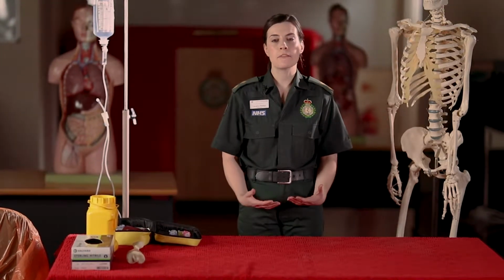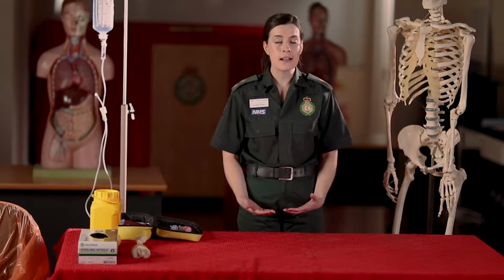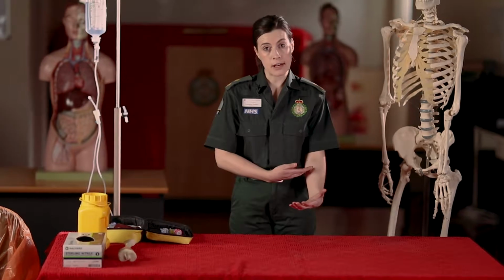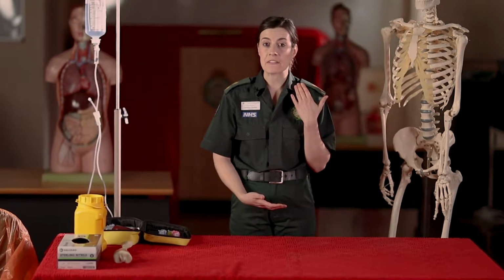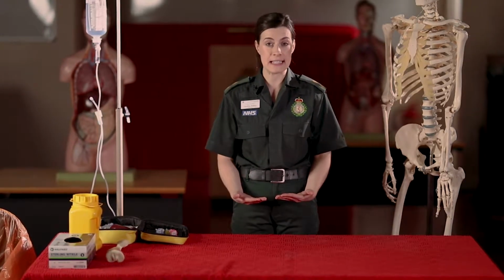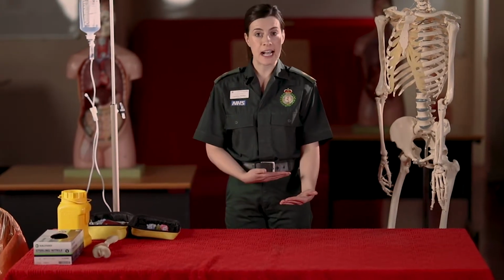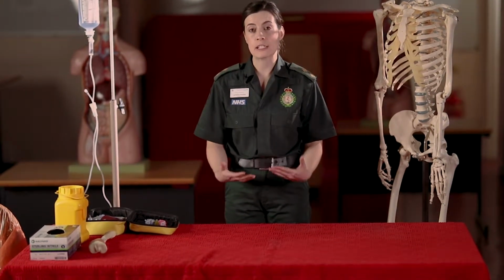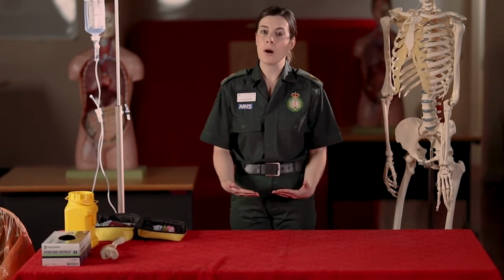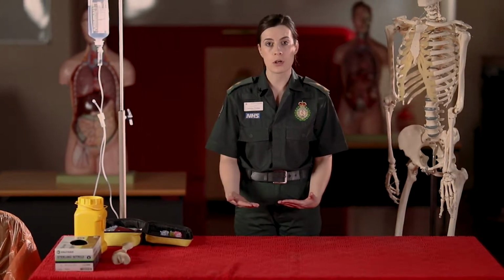The indications for performing an EZ-IO in an adult patient in cardiac arrest are that ideally we would like you to attempt a peripheral site first or an EJV. Having been unsuccessful, you're then permitted to attempt an EZ-IO. If trying to get a cannula or an EJV would delay treatment because of other interventions going on at the cardiac arrest, you are permitted to go for an EZ-IO attempt first, so long as you document why.